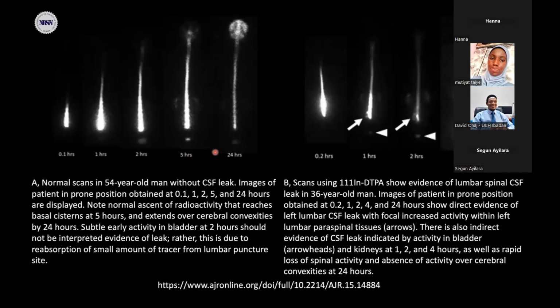So we take a look at the nuclear medicine imaging. This is the normal control one, where after 1 hour, 2 hours, 5 hours, we don't see any radioactive collection outside the subarachnoid space. Substance along the neural axis.